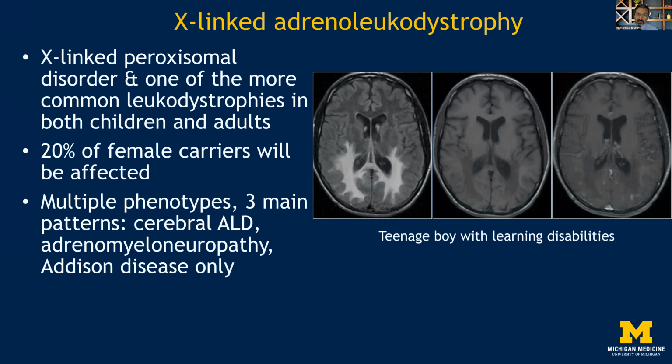This here is X-linked adrenoleukodystrophy. This is the most common inborn error of metabolism disorder in the brain, typically seen in male patients. However, keep in mind that 20% of female carriers will be affected by this disorder.